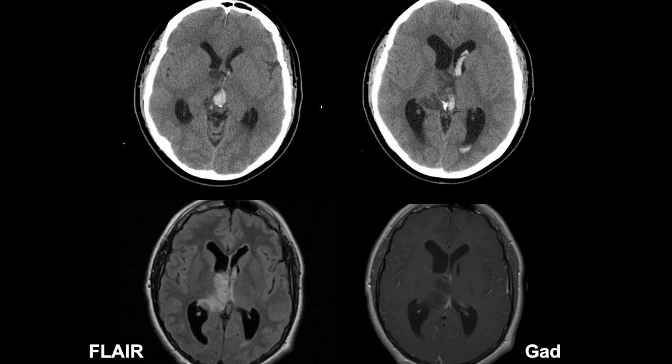But sometimes what can happen is you have an intracranial hemorrhage, you don't see clearly an underlying mass, you have kind of ruled out those other entities that we discussed previously, and you cannot find any of the other. And so then you have just to remember that it could be a brain tumor, and it's very possible that in the acute phase of the hemorrhage, because of the mass effect of the hemorrhage, the underlying tumor may be obscured. And so what is important in that setting is to obtain some relatively short-term follow-up imaging after a couple of weeks once the hematoma has resorbed, so that you have a chance to detect in a timely manner that underlying brain tumor.